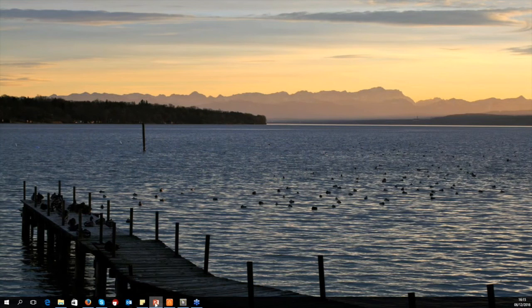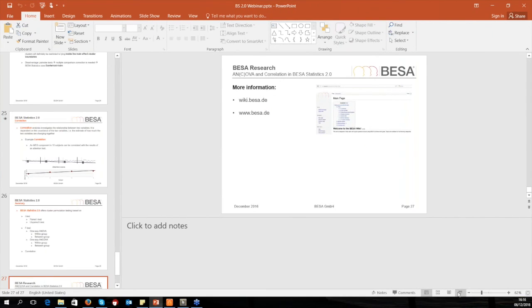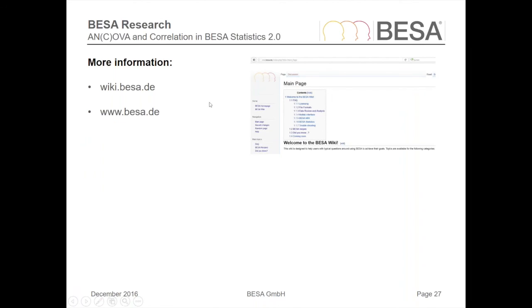Right, so there's a lot more to BESA Statistics, but we're running out of time, so I just want to point you to more information on the wiki, especially about FAQs, recipes, how-tos, and so on.